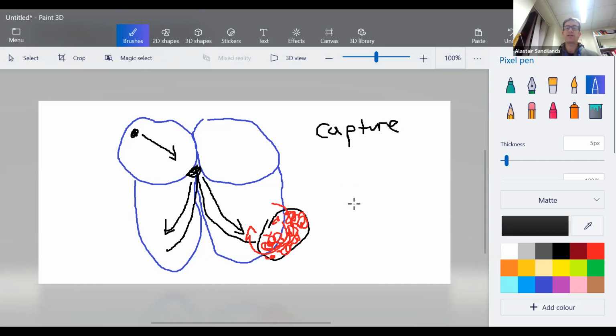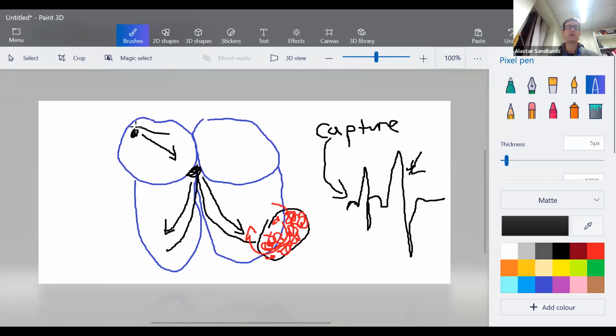And basically you'll see this P wave and a narrow QRS, okay, before it goes back to being the broad beat of VT. So there's the VT starting again. But this beat here is our capture beat as the sinus node captures the AV node, depolarizes down because the VT circuit is slowed down, perhaps within its scar.